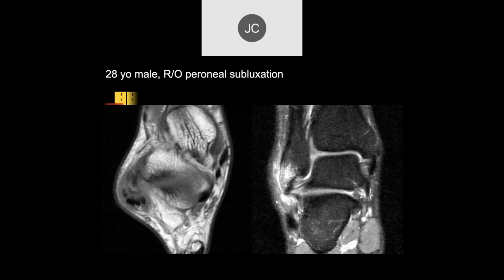When you put tension on the tendons, it tends to pull the longus into the brevis, and over time you can produce a midline split tear within the brevis due to the longus. And then if you have a lot of rubbing on the bone, you can get secondary edema within the lateral malleolus, and the bone edema both correlate with pain. There tends to be a little bit more pain when you see the bone edema, but split tears tend to be painful lesions.